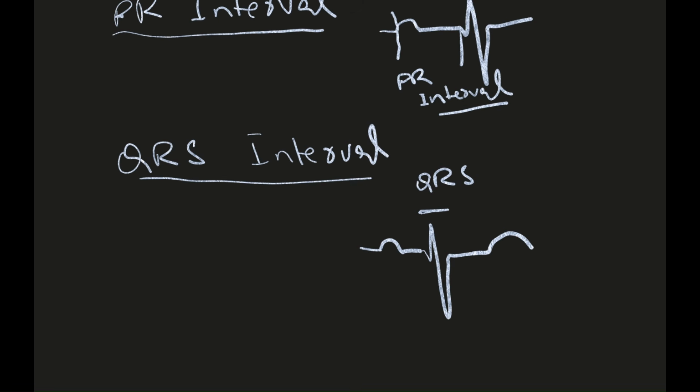Why is the QRS interval important? Because there are certain types of tachycardias, wide complex or narrow complex tachycardia. We will classify these tachycardias depending upon the interval of QRS.